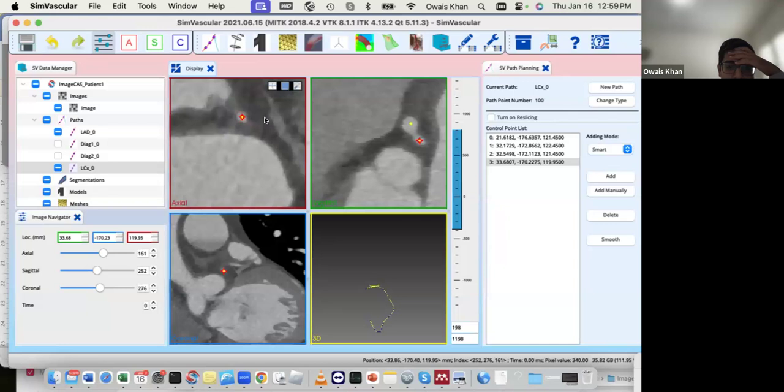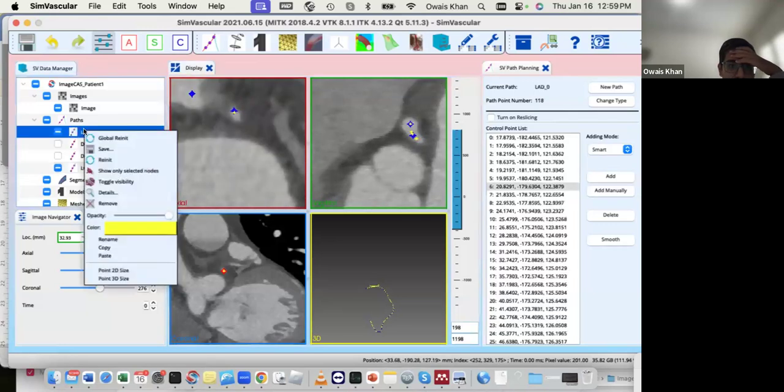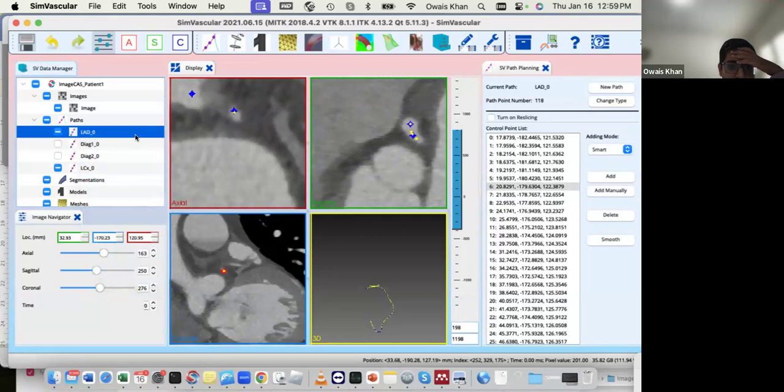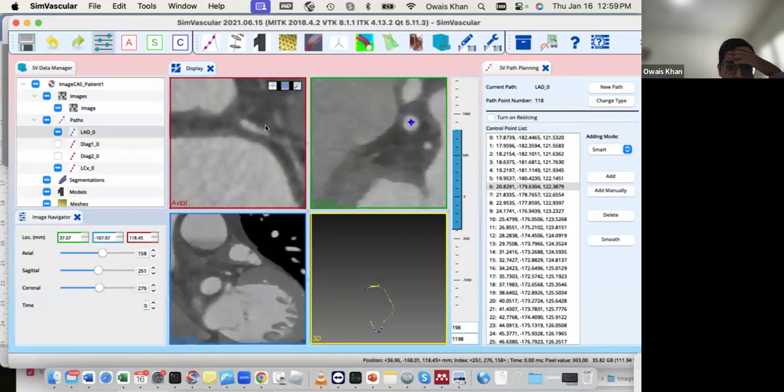And sometimes you might not know how to name them, so you can just name them whatever, and you can change the name anytime afterwards, right? Once you see the 3D tree, you're gonna know what the naming conventions are once you see the whole tree.